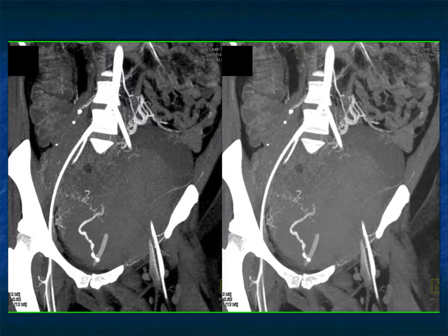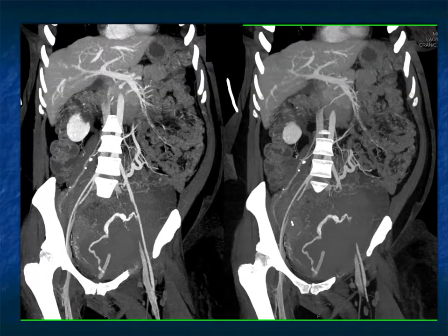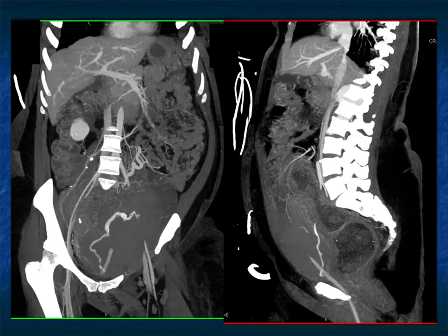This sometimes will simply be monitored, and hopefully the bleed stops on its own. If not, it may take lasers to stop the bleeding, but a pretty good example of active bleeding in the bladder due to trauma. Again, here it is as you go from the early to later phase imaging. You can see the jet gets larger. So this is really active bleeding, and very much like when you look at the colon and you see active bleed and the bleed increases from arterial to venous and it gets more extensive, those are the patients you're typically going to have to do angio on because the bleeding may not stop. I have to admit I haven't seen, fortunately, many cases of active bleed following catheter placement, but it indeed can occur.